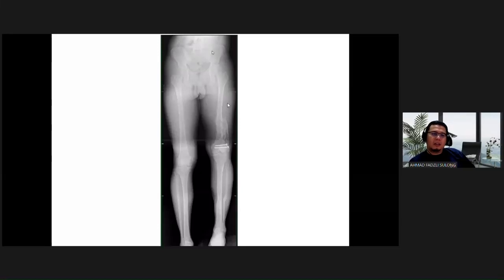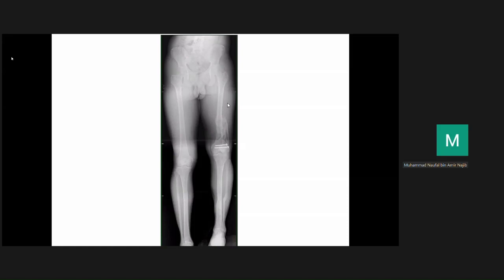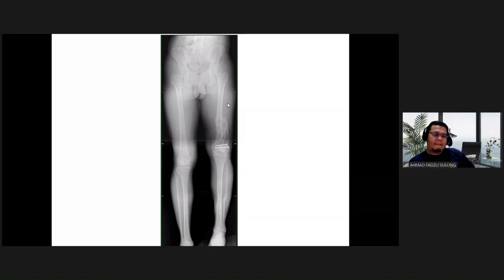Naufal ada? Ada. Oh, Naufal. Cepat. Komen X-ray ni, nampak tak? Nampak.